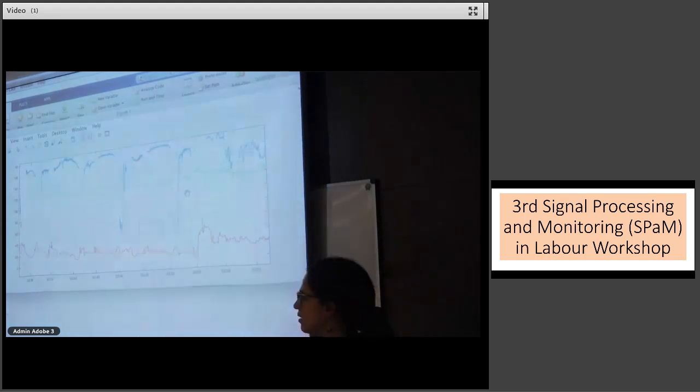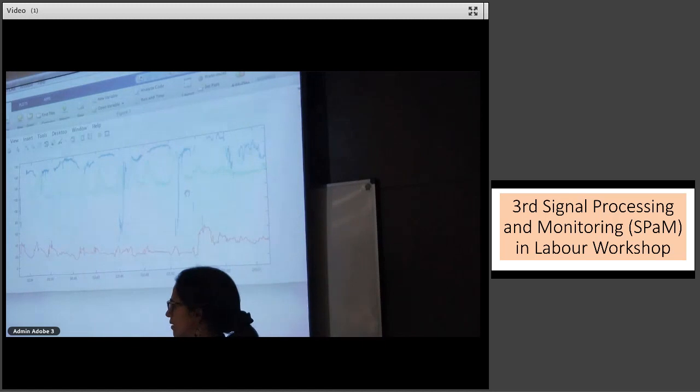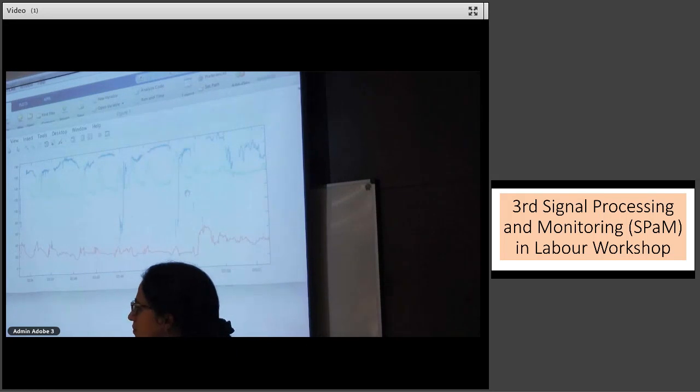Yeah. But actually, Barry was not saying the expression unstable. He was saying that it's undefinable. Undefined, yeah. Unstable is you can define it. You can define it, and it's just not holding its own. But that's what Patrice is after. It's a description of something where you can't define one rate, but at least you can see what it is between contractions. Indefinable rate is either it doesn't spend enough time at a given rate to be able to define a length of time of a consistent, stable, horizontal rate.